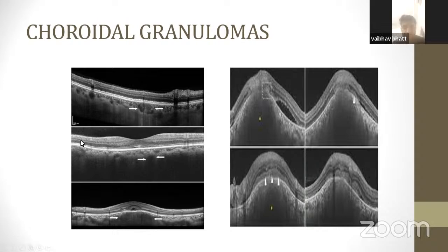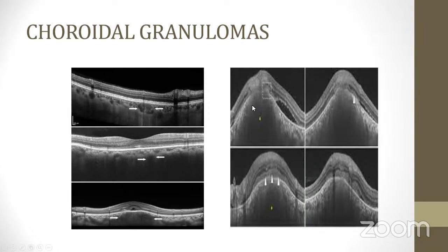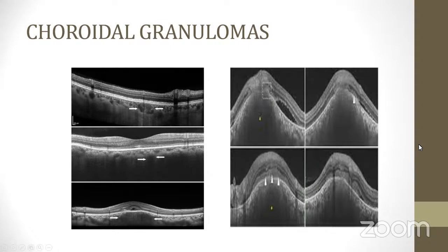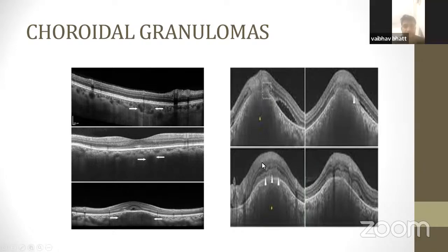As you've rightly shown, in tubercular granulomas, which is the picture on the right, there is full involvement of the full thickness of the choroid with total disruption, and also of the outer retina commonly, which is called the contact sign. Whereas in sarcoid, the lesions are mostly located within the choroid and the outer retina is spared. At the maximum, you may get some overlying subretinal fluid, but the outer retinal layers are fairly okay. That differentiates TB versus sarcoid choroidal granulomas. And obviously, TB granulomas are much larger in size and more solitary, whereas sarcoid granulomas are much more numerous and smaller in size. Please go ahead.